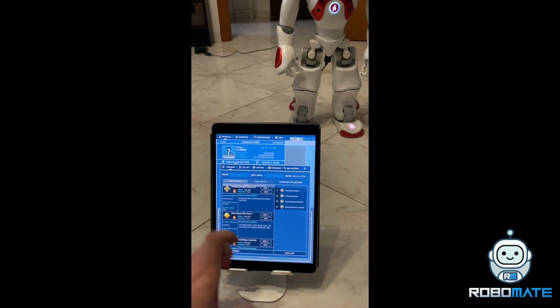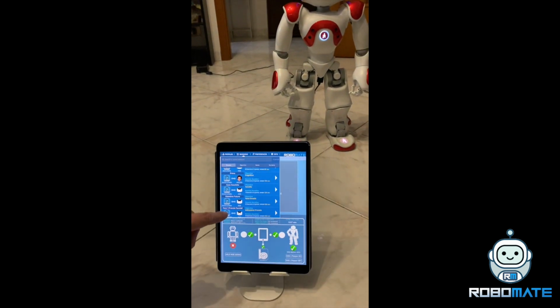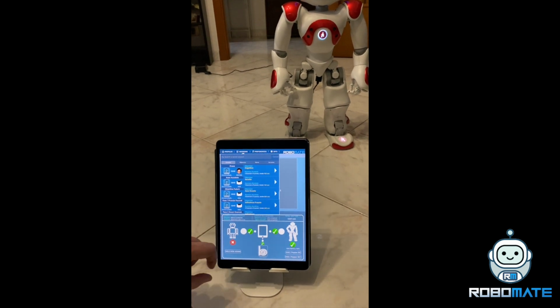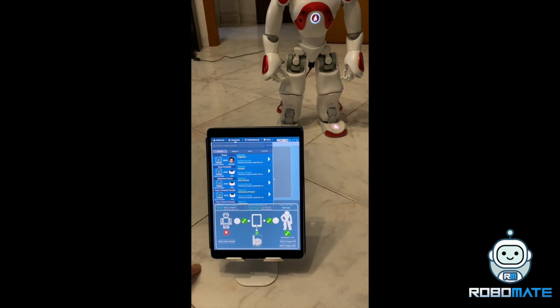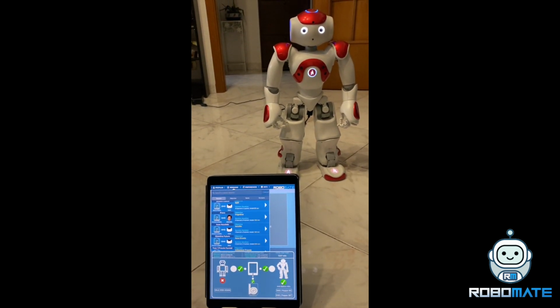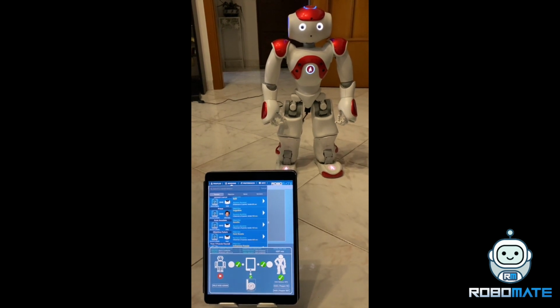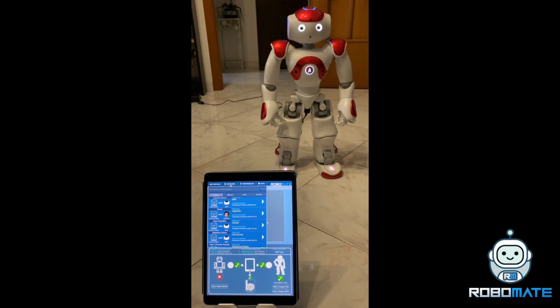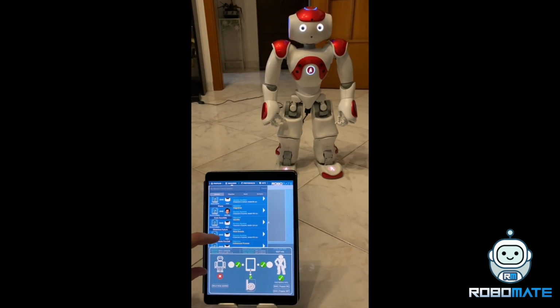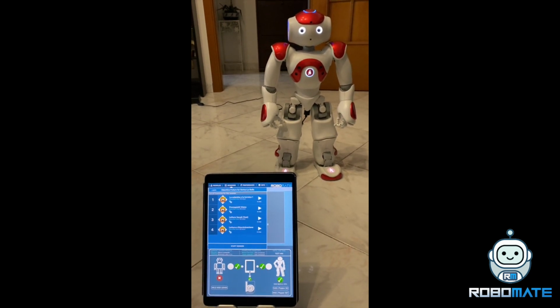And also, when we have done this, we can save the playlist and execute it directly using the robot we want to use. For example, in this case, we have a NAO robot. I have prepared an exercise where the robot shows you some objects, then removes one of those objects and asks which object has been removed. So we are in the area of memory exercises. The exercise is in Italian actually, and I will translate directly what the robot says.